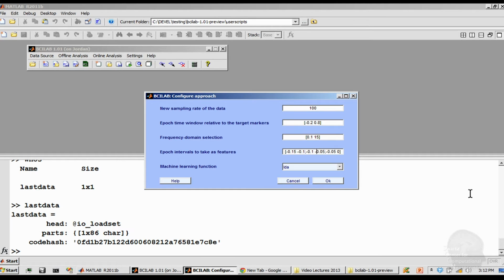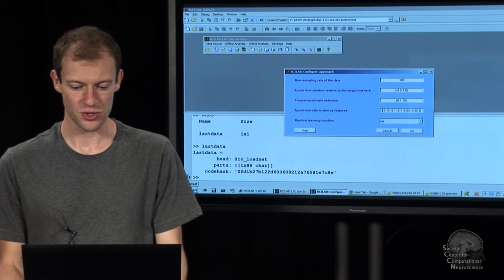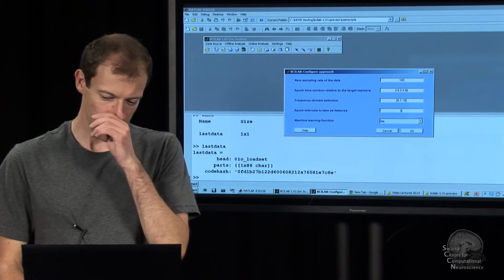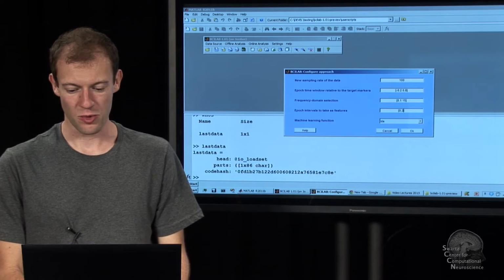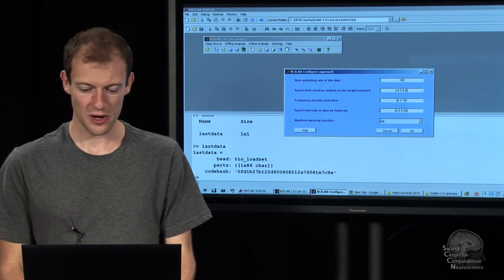And then the next step is this windowed means approach asks you to dial in little sub-windows in the epoch where you want to average the signal to extract features. And I have no serious prior knowledge on this data. All I know is probably there's not much going to happen before 250 milliseconds after you press a button or so. Or 200, say. So I start at 0.2. And I end, I also don't know much about the resolution in there, say. I just go up to 0.25. So now I have one time window.